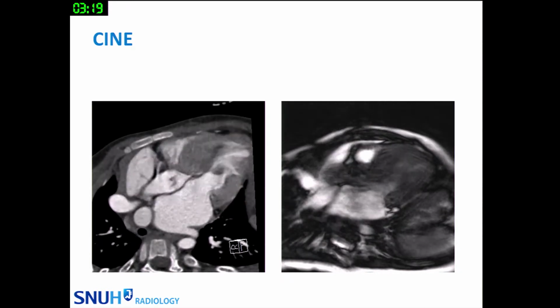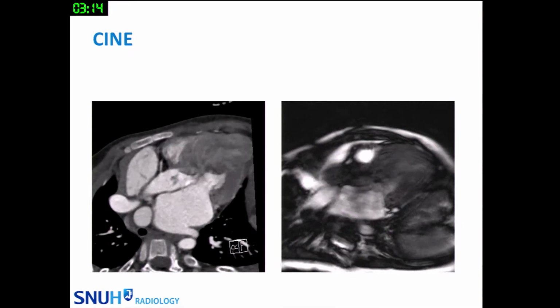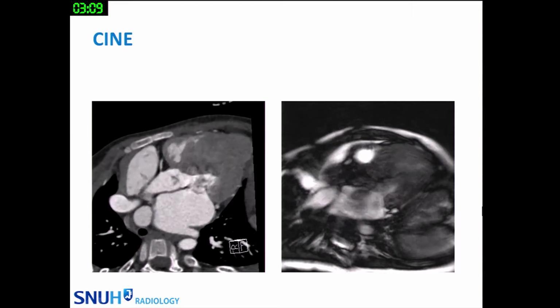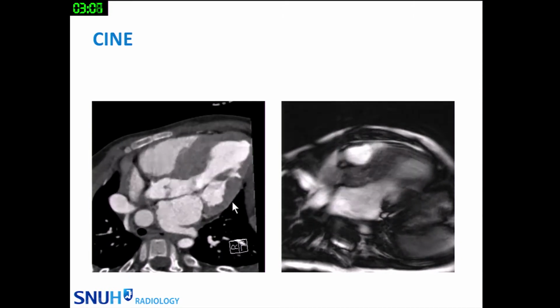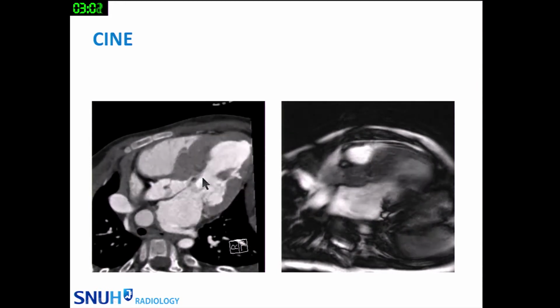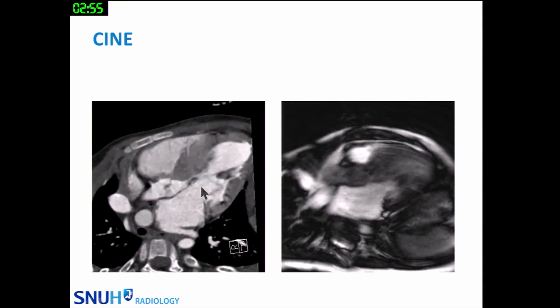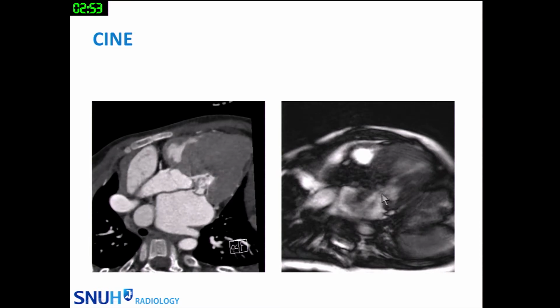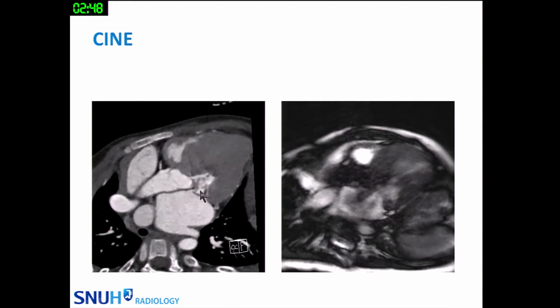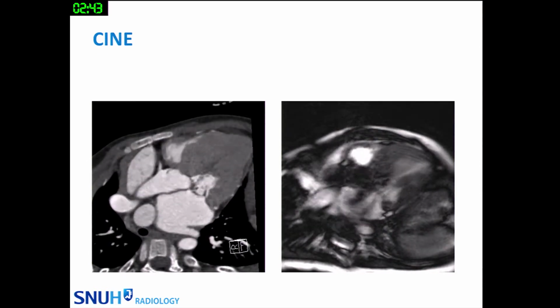As Arya already told you in the earlier images, this is a scene from the heart. In this patient, we have the same plane of MRI and CT for cardiac function, even mitral prolapse, asymmetrical septal hypertrophy, SAM, and the LVOT. In this image, the MRI is very poor at assessing that. In this case, the CT is better for seeing this kind of LVOT obstruction from the SAM. So CT can be used for some functional evaluation.